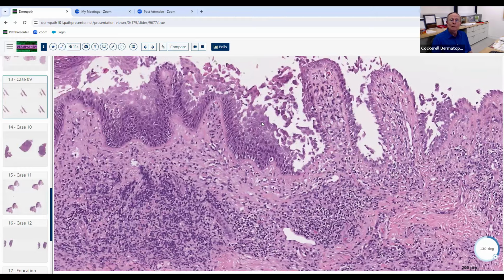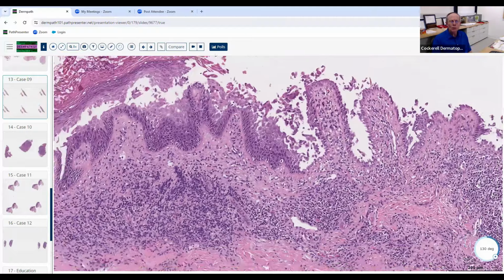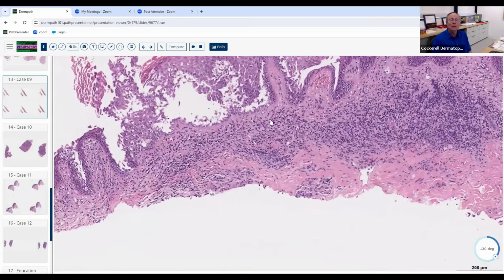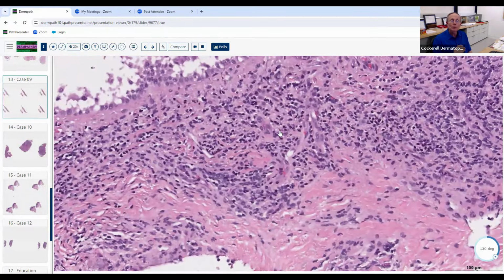They might throw Darier's. That's also acantholytic. It's acantholytic with dyskeratosis. There's a little bit of that over here. So once again, just going to show you that in the real world, these don't read the textbook. And this was true Pemphigus vulgaris here. It was positive with immunofluorescence. The patient had circulating desmoglein antibodies. So basically, it was Pemphigus vulgaris. But this is a good example just to show you in the real world, these things aren't always as straightforward as the textbook would make you think.